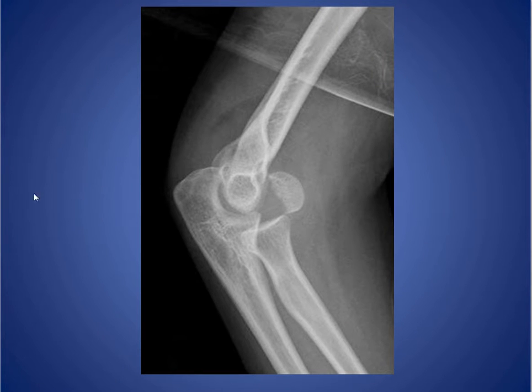Next type of fracture we're going to be briefly discussing is a capitellum fracture. So in this example we have a lateral view of the radiograph. Elevation of the posterior fat pad indicates there's a joint effusion. We see a bone fragment here floating in the anterior joint, and at first glance it may not be obvious where the donor site for that bone fragment is, but in this case you can see if you look at the radial articular surface there's a missing piece of bone on the corresponding humeral side, which is where the capitellum should be. So this is the displaced capitellar fragment.